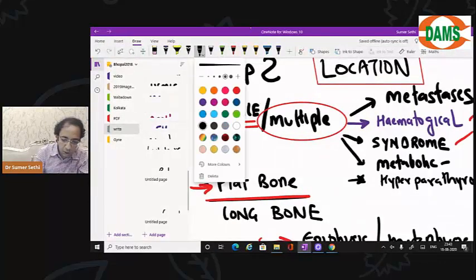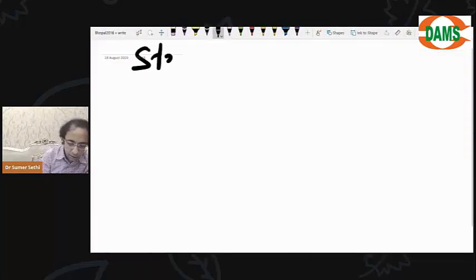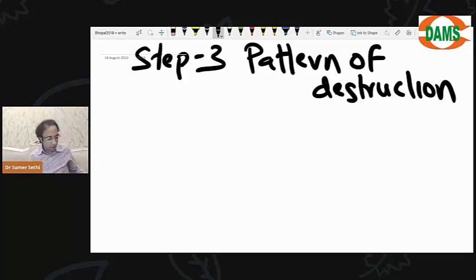Now we come to step number 3. Step number 3 is look for pattern of destruction.